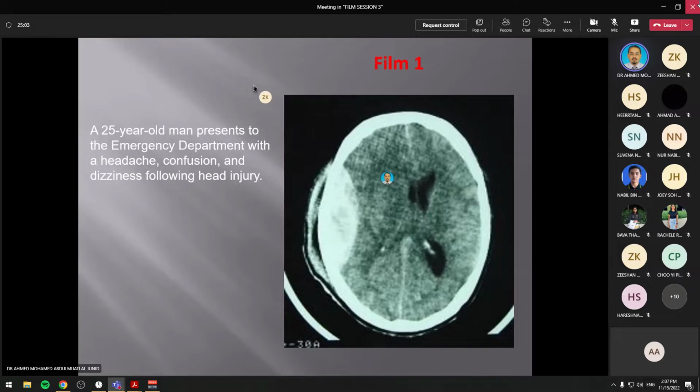But when you give the location, the first thing to say is right or left. That means, is it within the right hemisphere or left hemisphere? This one is right, that means within the right hemisphere. But where exactly? Right parieto-occipital region. For example, if it is in the right internal capsule, I will say right internal capsule. I will not say just internal capsule. You have to say right or left. So you have to specify whether it is in the right hemisphere or in the left hemisphere, then according to the region or according to the specific location. So this is number three, the location.